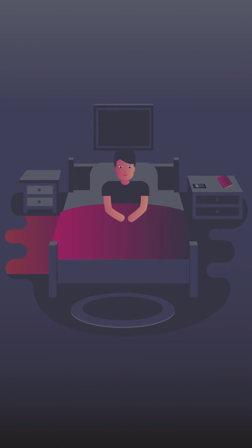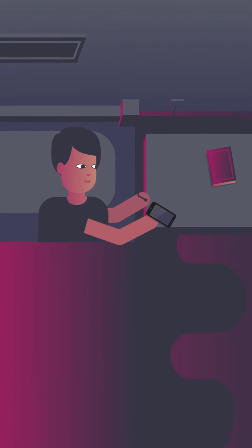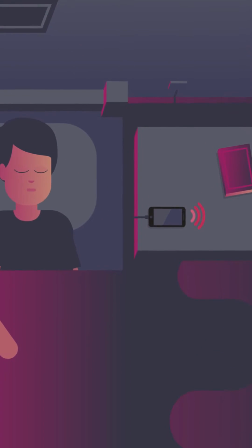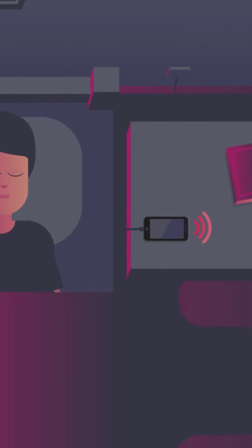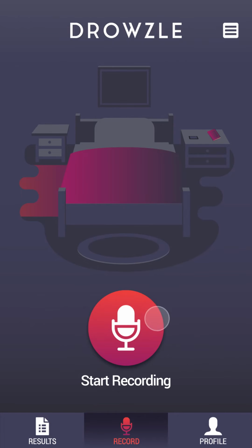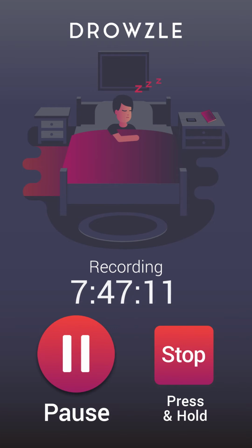Testing should take place in a cool, quiet bedroom. Plug your phone into a power source and enable Wi-Fi if not on. Place your phone 1 to 2 feet from your head with the microphone pointed at your pillow. Press record when you are ready to go to sleep. Press pause if you get up during the night, then press resume when returning to bed. When you awake in the morning, press and hold stop.